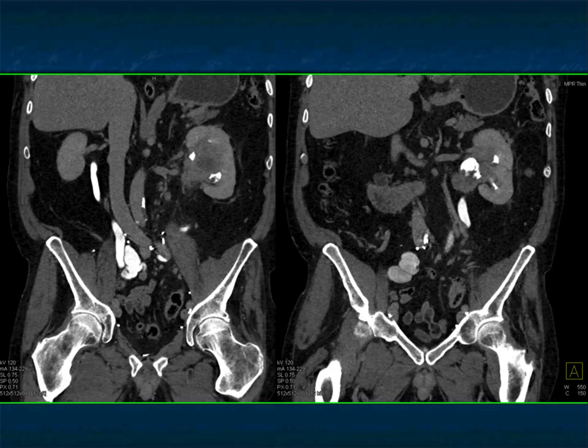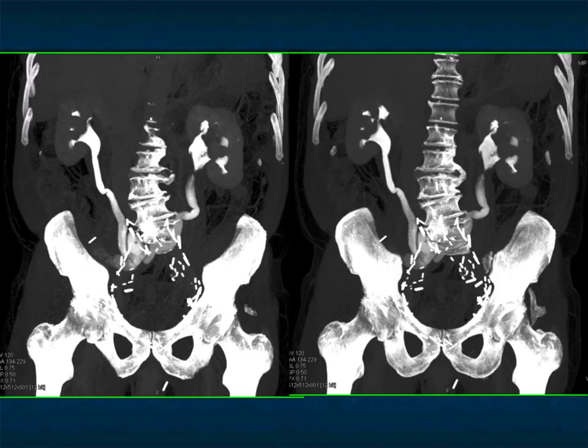But again, the epicenter tends to be the renal pelvis, which puts you more into the TCC category. I don't think you're always going to be right. In this case, I would surely have said I would want to make certain the patient does not have lymphoma. I know the patient previously had TCC, but still, people get 2 different types of tumors.